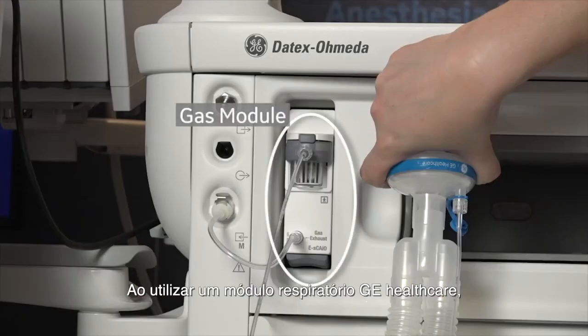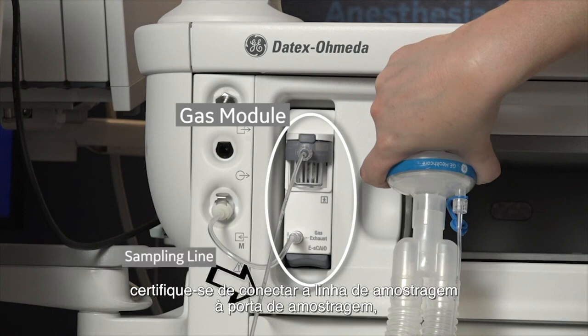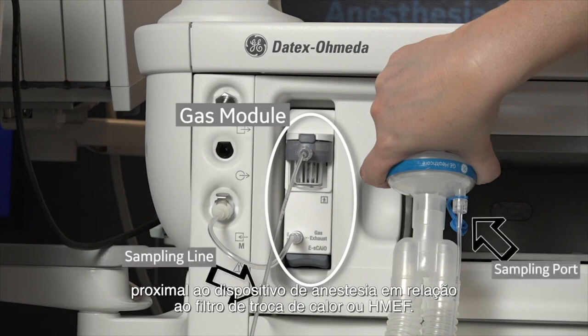When using a GE HealthCare respiratory module, make sure to connect the sampling line to the sampling port proximal to the anesthesia device with respect to the heat-moisture exchange filter, or HMEF.